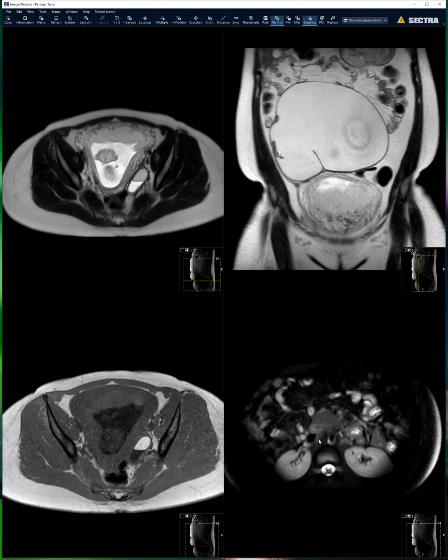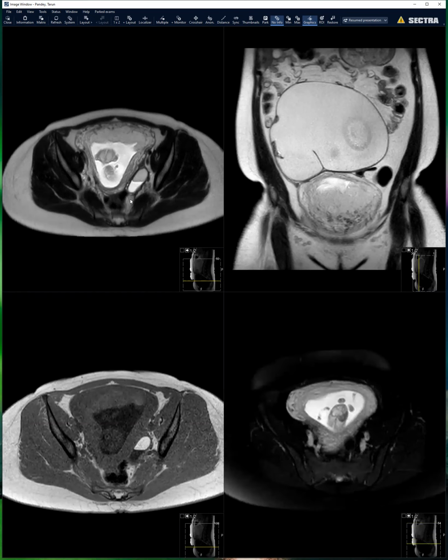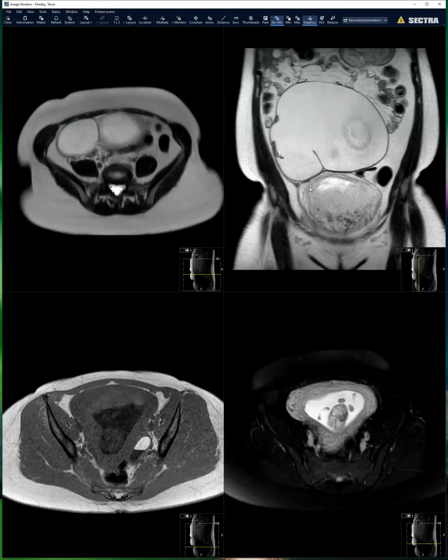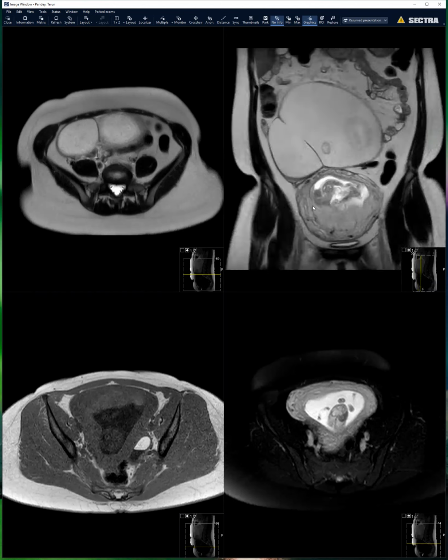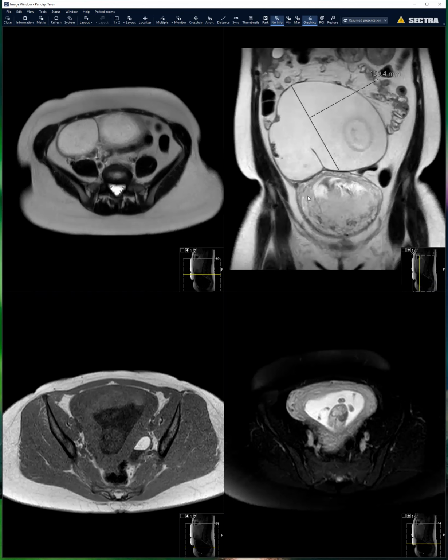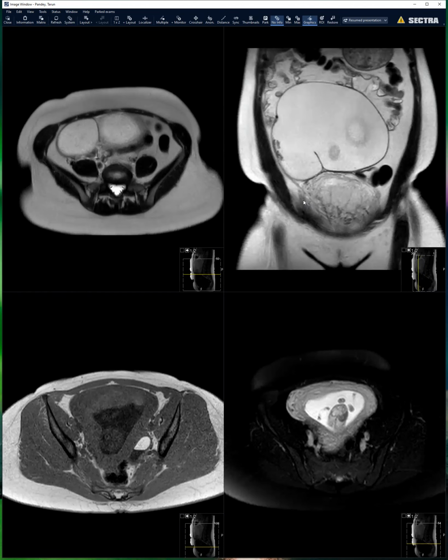So this patient did undergo robotic surgery, and they did confirm that this was a dermoid, and it had actually ruptured. So when you say ruptured, is it a dermoid of the fallopian tube that ruptured in the fallopian tube, or an ovarian dermoid that ruptured? Or you can't tell? Well, based on their path note, it looked like they meant that it was an ovarian dermoid which ruptured into the tube.